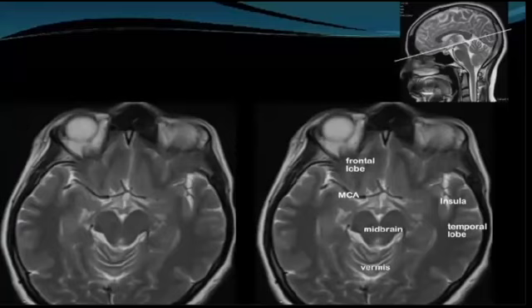Okay, someone said flare. Why are you thinking flare? Okay, people who said flare, please tell me, why are you thinking flare? Give me any reasoning. They say because the white matter is darker. Okay, but the white matter is also darker on the T2. So why are we still thinking that this is a flare?